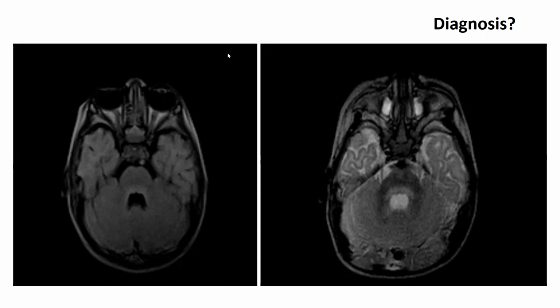Sir, there is a hyperintensity in the bilateral temporal lobes, with hyperintensity in the pons, pontocerebellar junction. So the dorsal pons, the temporal lobe, it is not a prominent thing, but there is the involvement of the dorsal pons. If you can see, there is hyperintensity. This image also shows it almost like a mustache. The dorsal pontine hyperintensity is present.